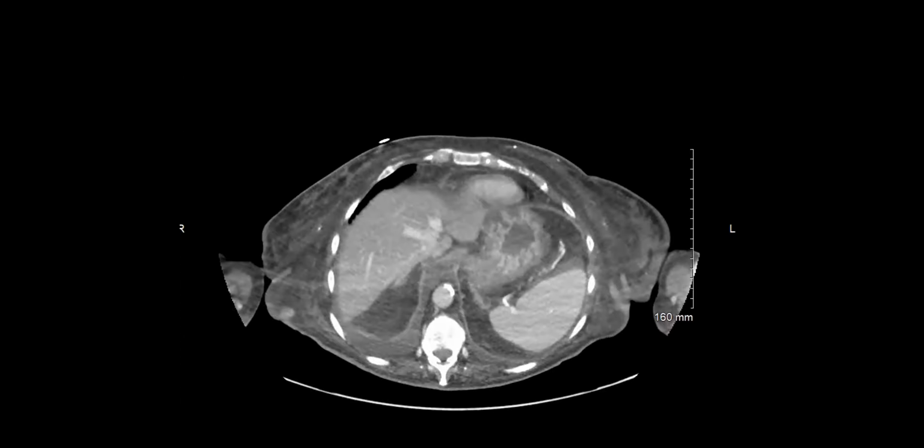They needed to access the biliary system, but because of the altered anatomy, I've seen them come up with creative ways to access it. I've seen one case where they reconnect to the excluded stomach, but in this case, they put a stent across and into the excluded stomach, percutaneously, to then access the biliary system.